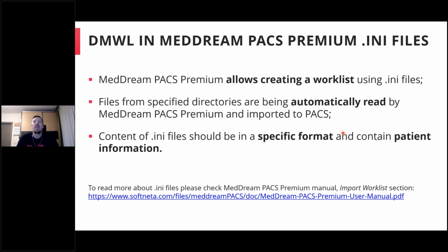The second way how the worklist can be created in the MedDream PACS Premium is using the Windows ini files. MedDream PACS allows creating worklists using these ini files. So these files from a specified directory will be automatically read by the PACS Premium. They will be imported to the database and the file will be deleted.